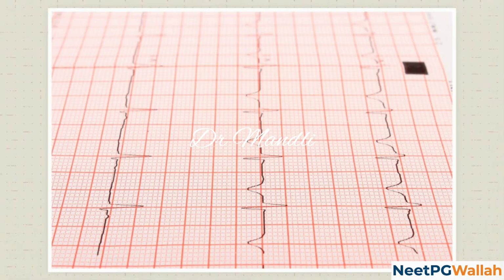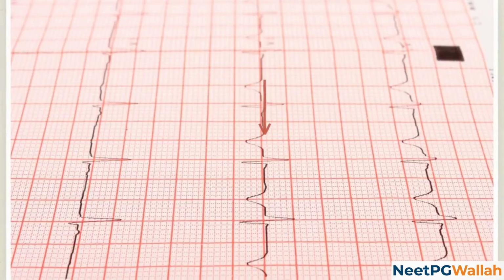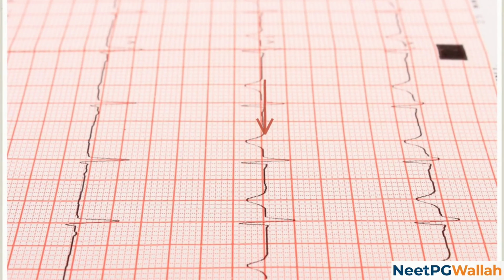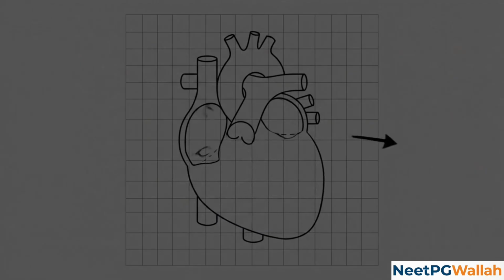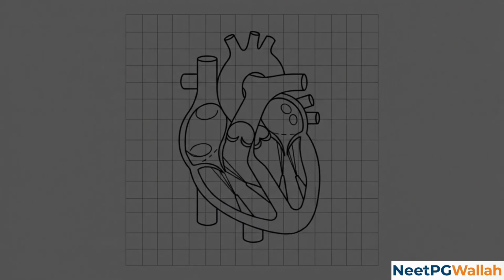Standard ECG paper is a mathematically precise timeline. Every large square and tiny square inside it represents a fraction of a second. Plotted along this timeline is a sharp upward line called the QRS complex. This spike is the visual representation of a single human heartbeat, specifically the moment the heart's lower chambers contract.